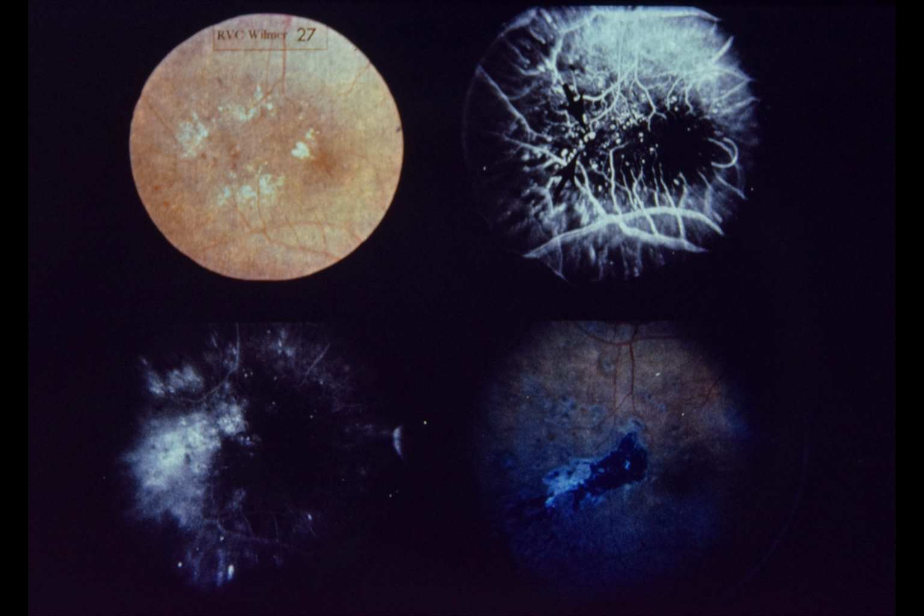Hard exudate encroaches on central fovea. Upper right, 23 seconds after dye injection, note preponderance of vascular abnormalities are seen inside lipid ring. Lower left, 15 minutes after injection, note extensive dye leakage into retina and cystoid maculopathy.